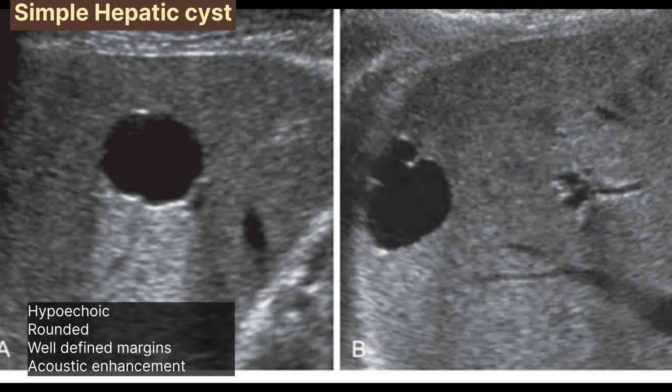Here we are going to discuss the hepatic cysts in different patients. Hepatic cysts show the classic findings. Hepatic cysts are mostly rounded and they show regular margins with acoustic enhancement.